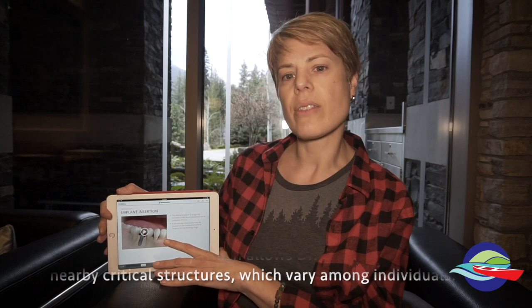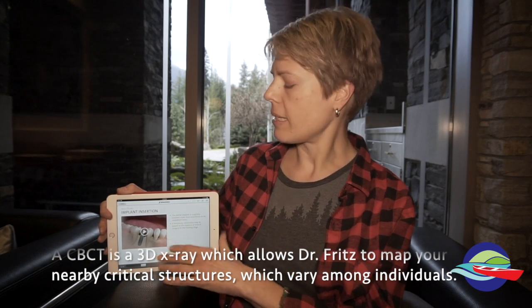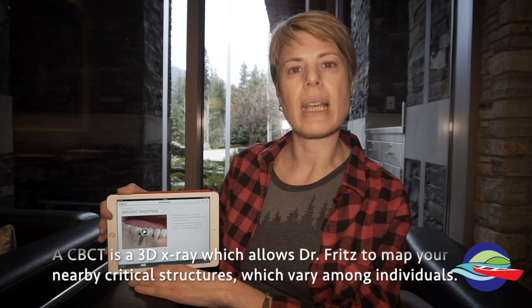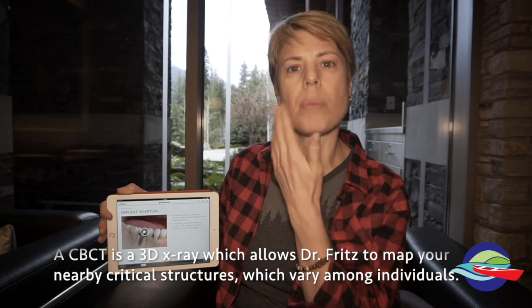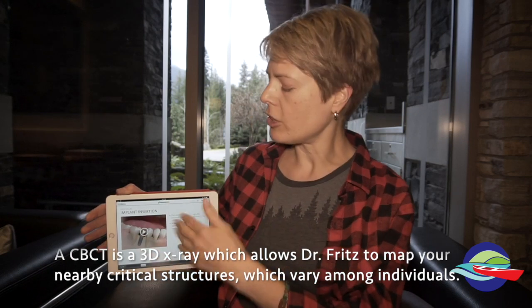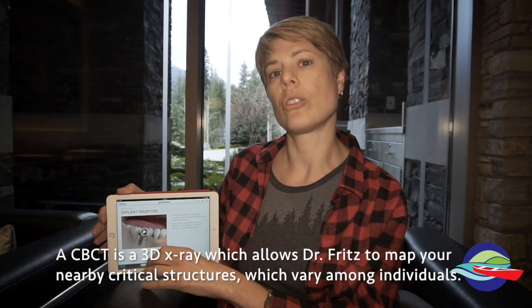So once the 8 to 12 weeks of healing has occurred, then the patient will return to the office, and what we'll do is a CBCT in order to plan for the implant. So I let the patient know that this CBCT is very important, as when we take it, we're looking for anatomy that is in the area where we're placing the implant. So on the bottom jaw, we're looking at where the mental nerve is. On the top jaw, we're looking where the sinus is and the adjacent teeth in order for Dr. Fritz to plan that surgery.